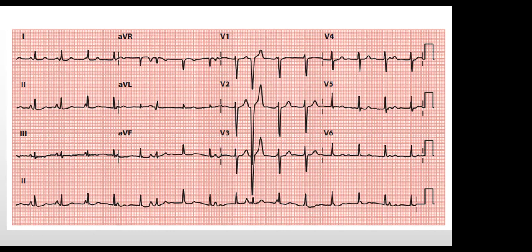So MAT does happen in the context of COPD, but once the heart rate is less than 100, you tend to say this is wandering pacemaker beat. But if the heart rate is more than 100, that's what you define as multifocal atrial tachycardia. Like you said, in some instances you don't even have P waves, which can also explain the fact that it degenerates into some form of paroxysmal atrial fibrillation.